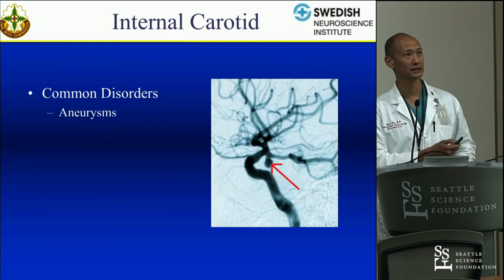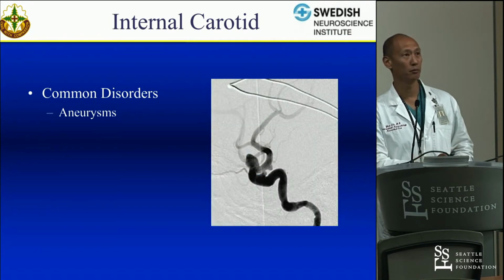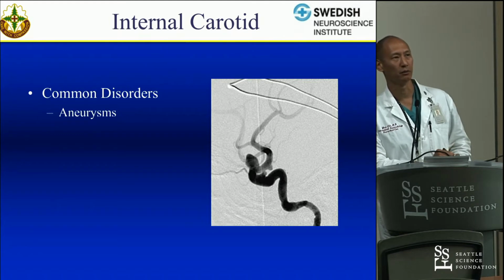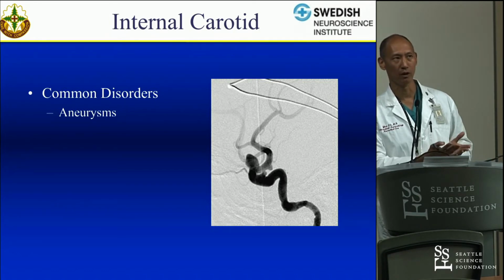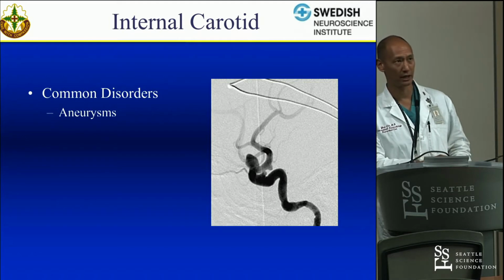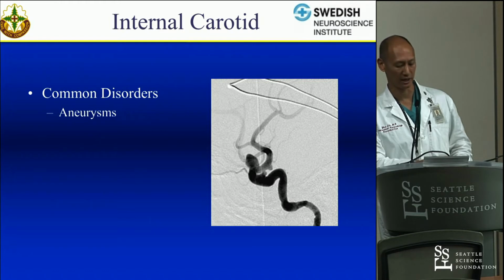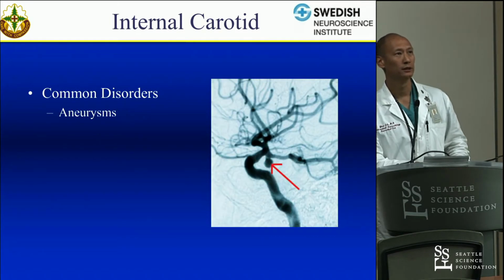If the aneurysm arises a little bit more posterior and tends to point laterally, those aneurysms I will term a para-ophthalmic aneurysm. But most ophthalmic aneurysms, because of the relationship to the ophthalmic artery, typically arise and point superiorly. Ophthalmic aneurysms can get fairly large, and like anterior communicating aneurysms, they can present with vision loss because of compression of the optic tract or the chiasm or the nerve.